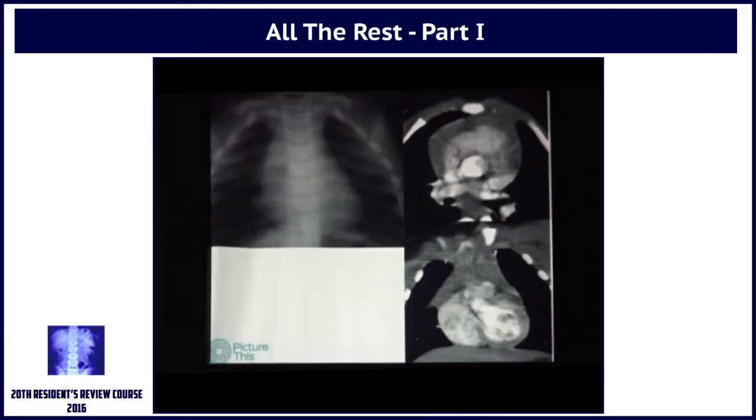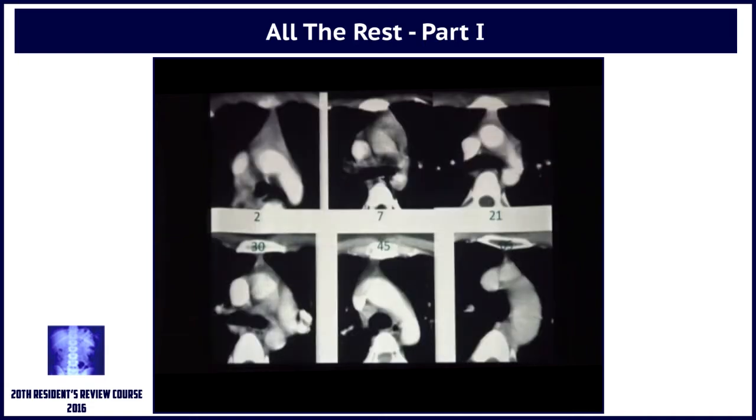When the thymic hyperplasia is not so significant, it can be a little difficult, as here the thymus is seen enveloping the vessels. It goes from medial, or from right to left. But again, when you look at the coronals, you see the sharp edges, the lobulated appearance and the arrow-shaped appearance, and this is clearly a thymus.